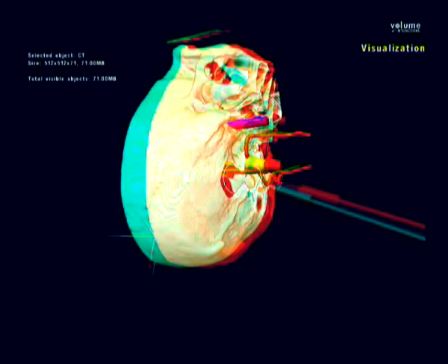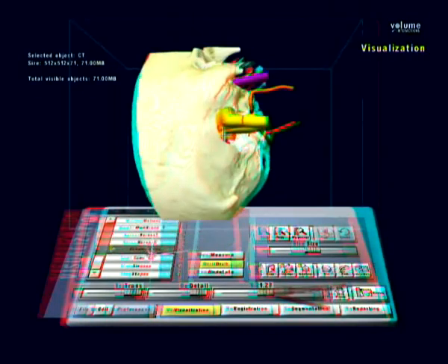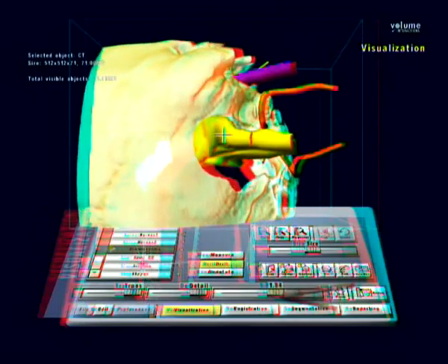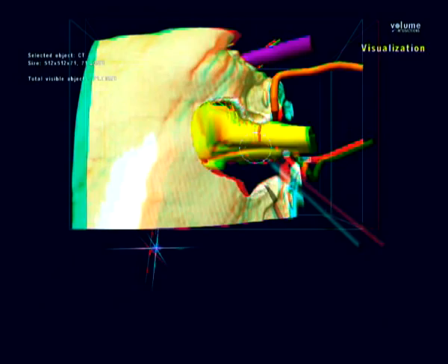In the transcondylar approaches used to expose the anterior cervicomedullary junction, a lower craniotomy is performed, which incorporates removal of the lip of the foramen magnum. The vertebral artery is exposed from its extracranial to its intracranial course as it winds around the occipital condyle.